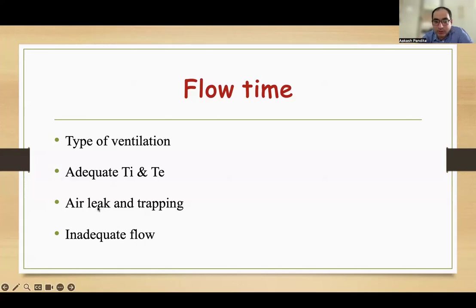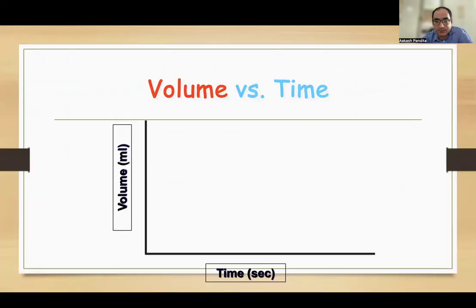It also tells me about the air leak and trapping, although there are other graphics also to tell us about the same. And it also tells me about the increased resistance, in which the peak expiratory flow will come down and it will take longer time to reach the baseline.